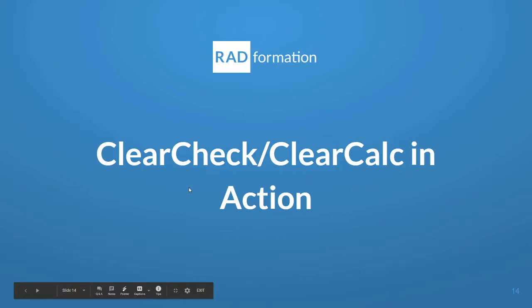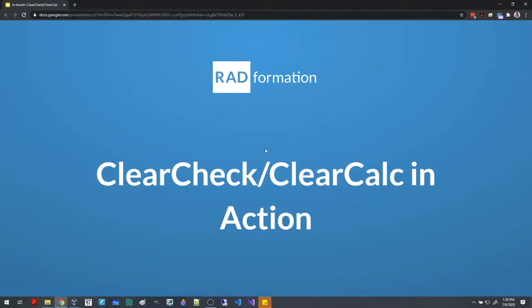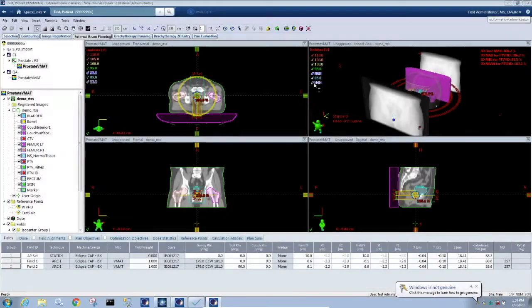All right, so let's see what this looks like in action here. In this case, I'm just going to show you a photon plan. I do have a VMAT here. I've also added on, as you can see, a QA course, so you can see what the portal dosimetry results are going to look like in ClearCheck as well.